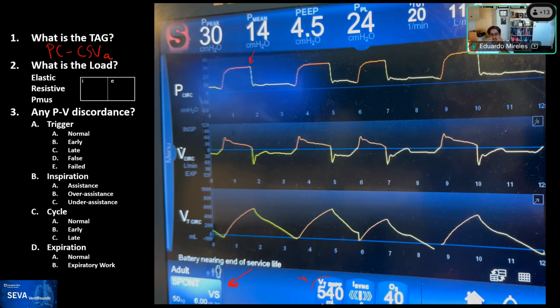Yeah. And what was your next? So if we think about this patient now, there are several features that the team is talking about: increased resistive load, right? And it could be intrinsic because of bronchospasm, or there's an ET tube narrowing, or the tube is against the wall, or something along that nature. Or it's a small ET tube.